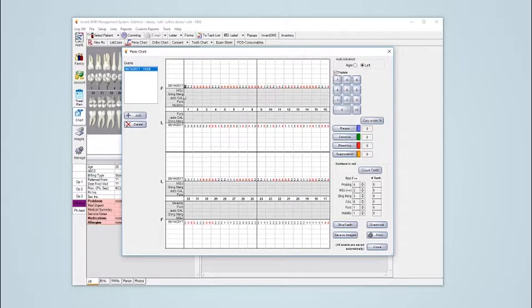We have the other functions just right beneath the probing numbering. We have the mucogingival junction, and next to it is the gingival margin, and then we have the auto calculation beneath that. The auto calculation will help dentists understand the clinical attachment level, and then we have the furcation, and finally we have the mobility.